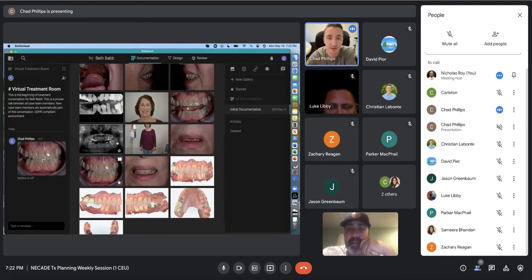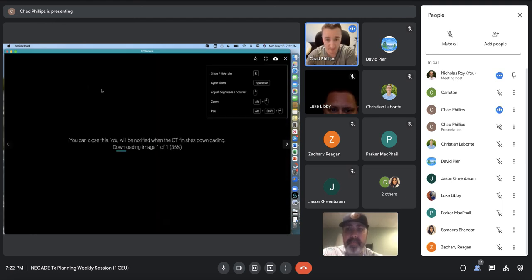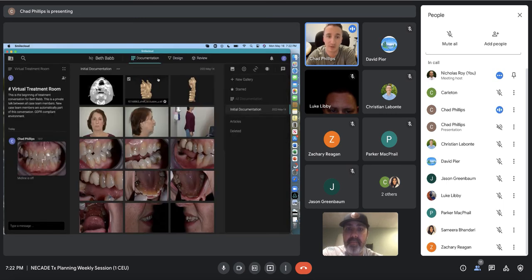And then just kind of submitted them as JPEGs. Now the CAT scan, is that actually viewed? So that's something I'm still kind of figuring out. For some reason, it pulls up like this, and then nothing happens. I know it's possible to view it on there. I just don't think I imported it correctly.